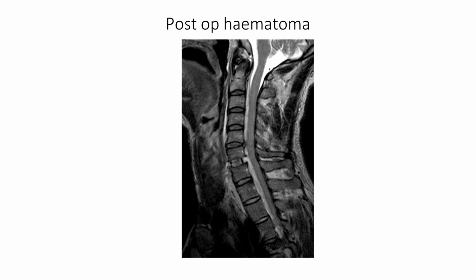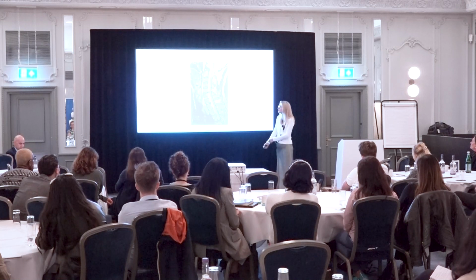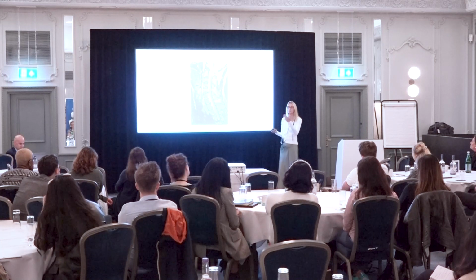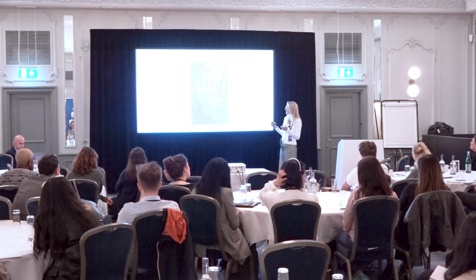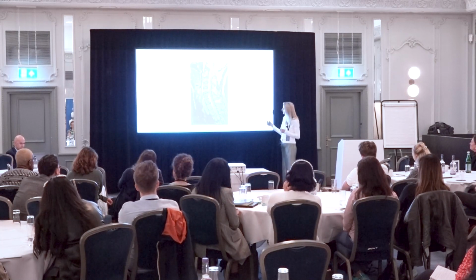But one of the features, if you forget all of this here and here, when you have a disc spacer from surgery, you always get some fluid oozing behind the spacer. That's normal. I've seen a few medico-legal cases where they've talked about hematomas, and actually that's just the normal appearance after surgery. Someone has criticized a surgeon to say that it hasn't been placed correctly. In fact, it has, and it's just a radiologist who doesn't deal with post-operative cases.